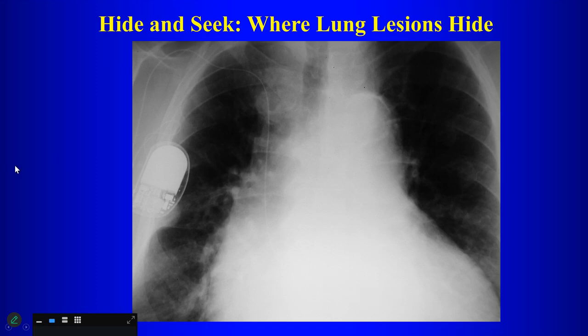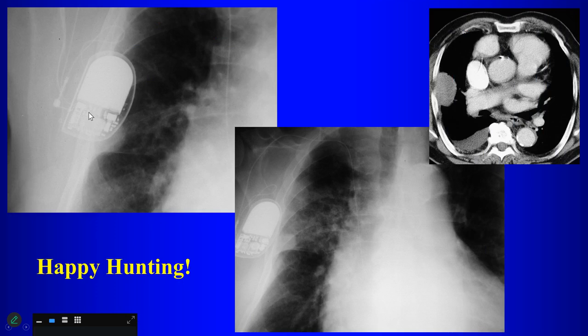So that's our discussion of where lesions are. By the way, where's the lesion on this X-ray? Right paratracheal? Anybody see anything else? Right lateral lung? It's behind the pacemaker. Oh, jeez. Okay? Tricky. That's mean.